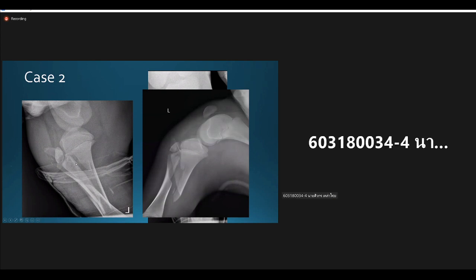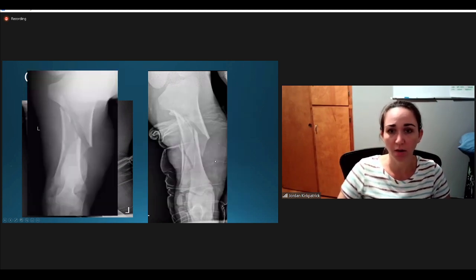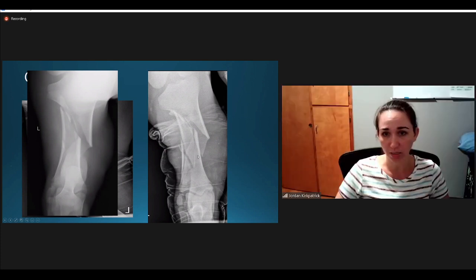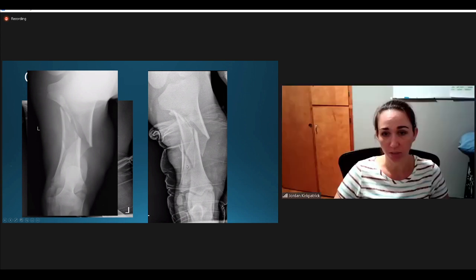And you can see there's more cranial displacement. There's another line here, but most of the damage you can see on the cranial caudal view. So again, this is the radiograph that I was sent, and this is the fracture the next day. There's more lateral displacement and more proximal displacement of the distal portion. There's more fracture lines. And there's a fracture line propagating down.